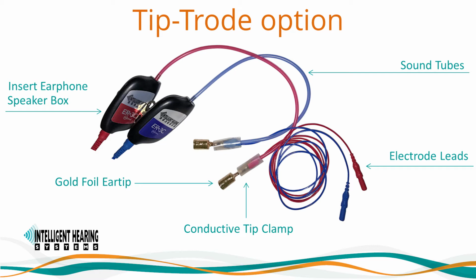The red lead cable will capture the right ear auditory evoked response signal, while the blue lead cable will capture the left ear auditory evoked response signal. The last component is the tip of the Tip-trode cable, where the gold foil insert foam ear tips will be placed.